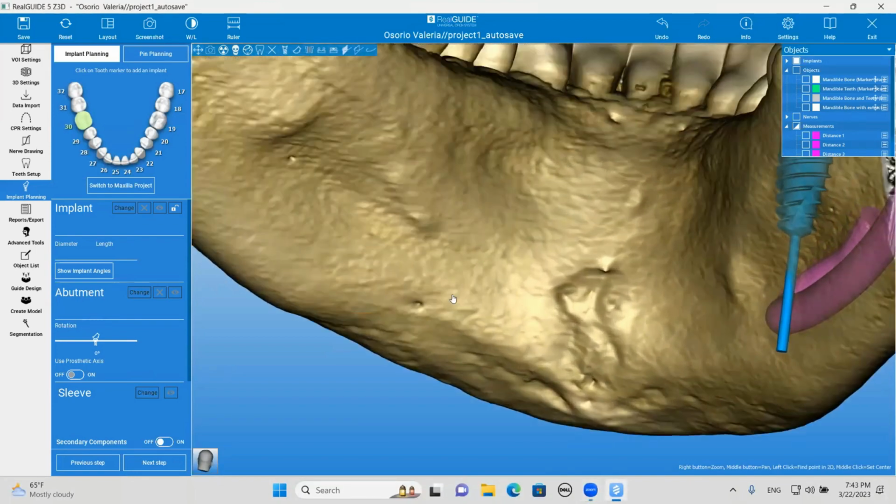Okay, see that little opening? Well, I can't ask the question because we can't have people answering it, but let me tell you what that is. That is an aberrant nutrient canal. We have numerous ones. So what happens as the inferior alveolar nerve traverses anteriorly, it has the two terminal branches, which is the mental nerve and the incisive nerve.